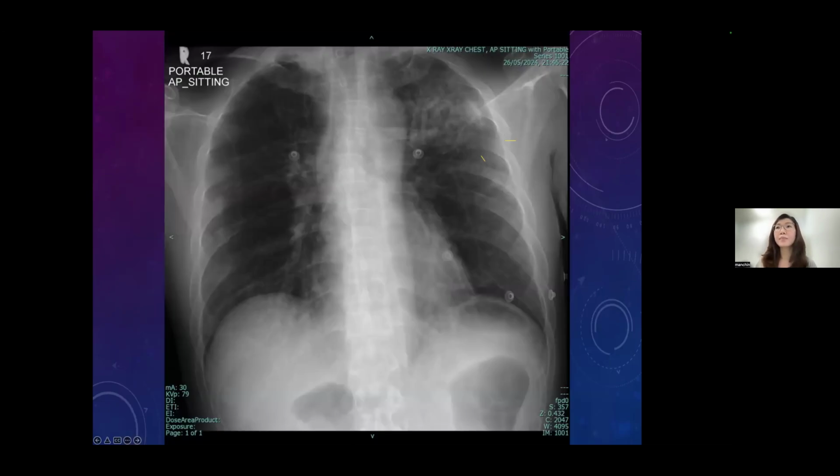So what about this? There's a left upper lobe consolidation. Okay, consolidation with air bronchogram within. So this is an infection, just a pneumonia case. And then what else in this X-ray can we see? You see already, mediastinum quite okay. There's no splaying here. So look at the bone.